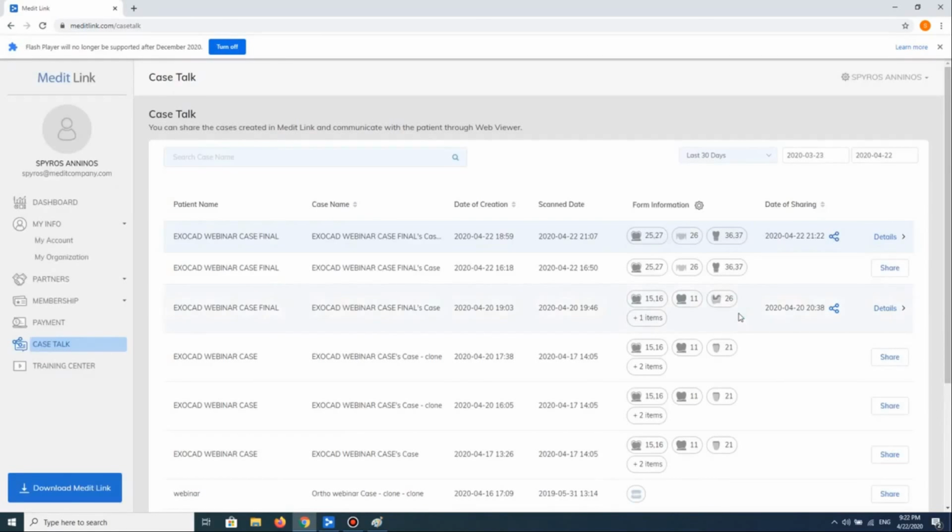And now this is another important, crucial point. As you know, we share data that belong to the patient, so they have to be safe. So what do we do about that? In case, let's say, something by mistake, somebody receives the link, it's not enough.